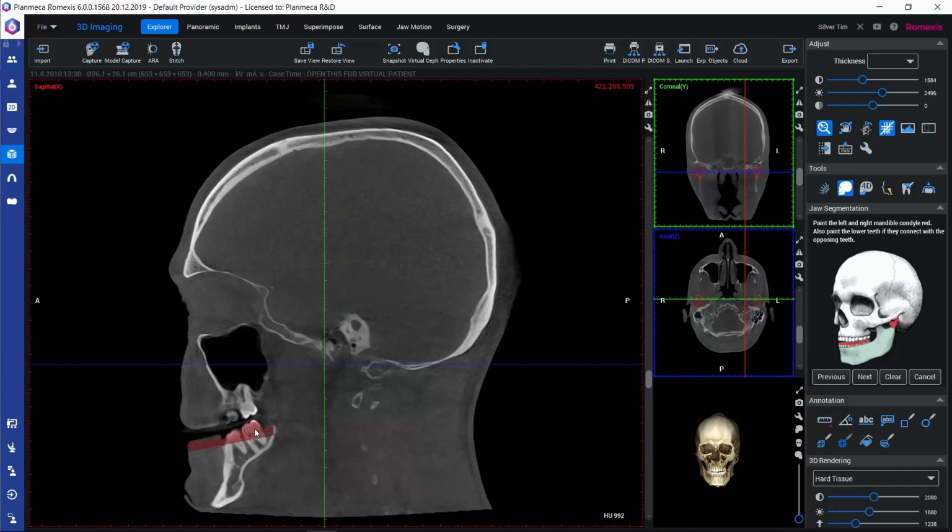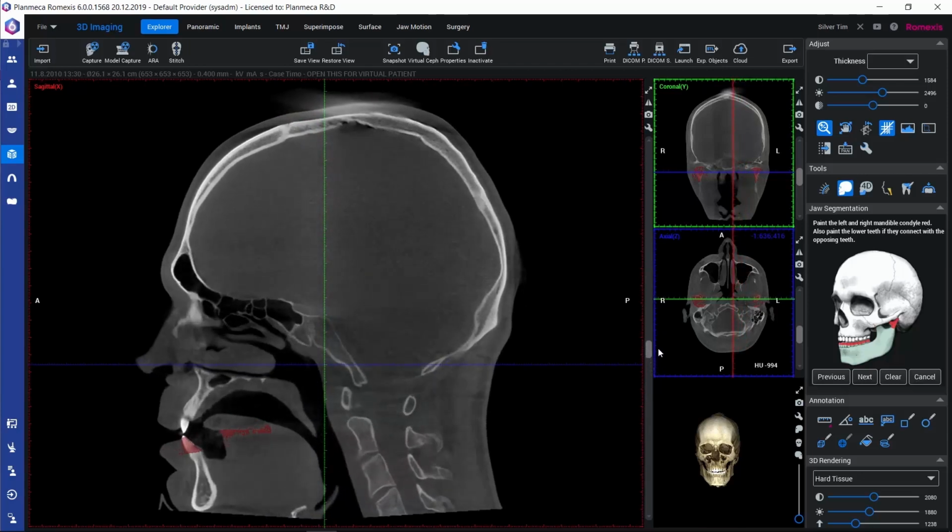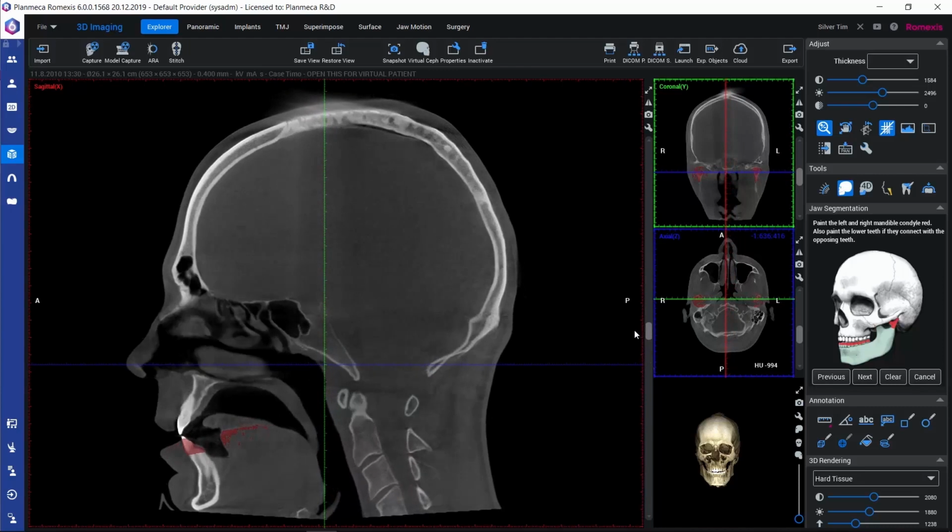We could resize this painting cursor, like we see, it has turned into this sphere. So with this one, we can still add the paint, or we can remove it, and we can resize it by keeping Alt down on the keyboard and by using our mouse wheel. So we could paint some finer details. So we could add paint using left mouse button, and we could also remove paint using right mouse button.